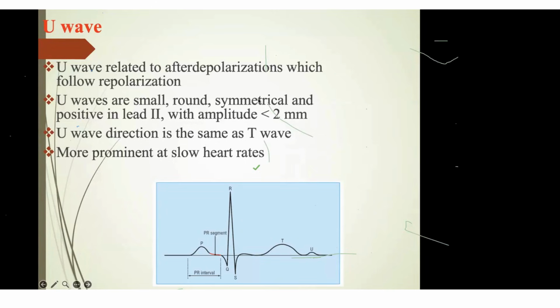Initially, the serial ECGs will show the T wave going up and the R wave coming down. So that's the initial part of the anterior MI. If you can find it at that time itself, it is very important to know this hyperacute T wave.